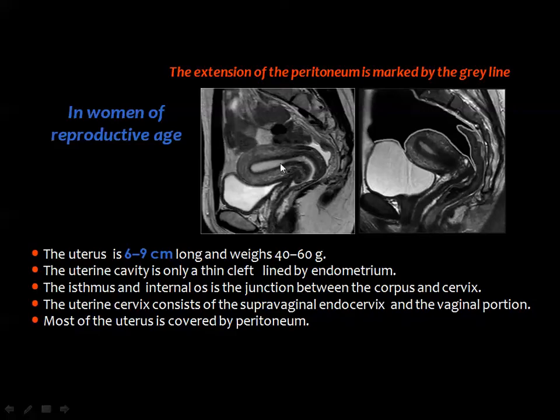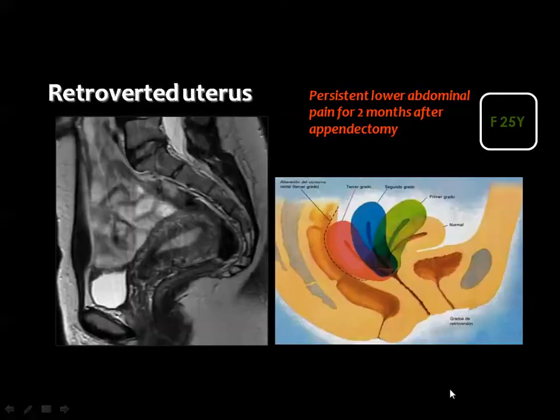And you can continue into the cervical canal, and this is the upper part of the vagina. You know that the uterus is an extra peritoneal organ. It is covered on its surface by the peritoneum, which also covers the urinary bladder vault.